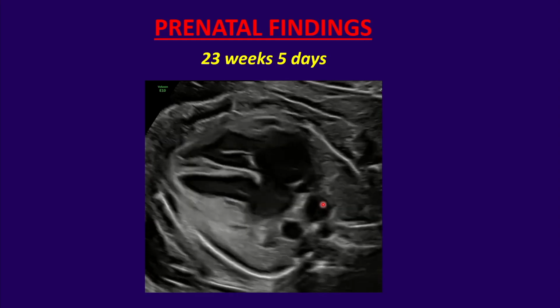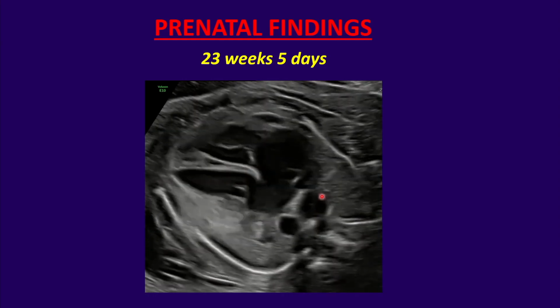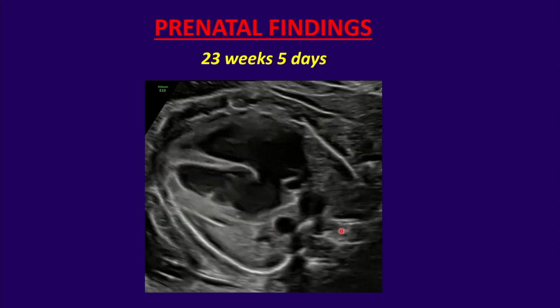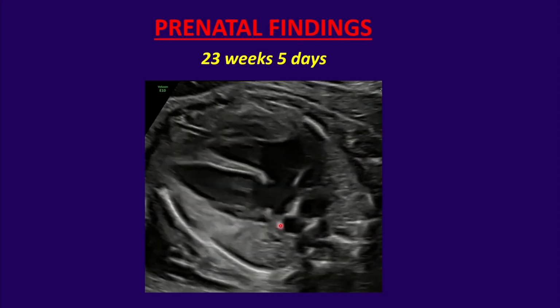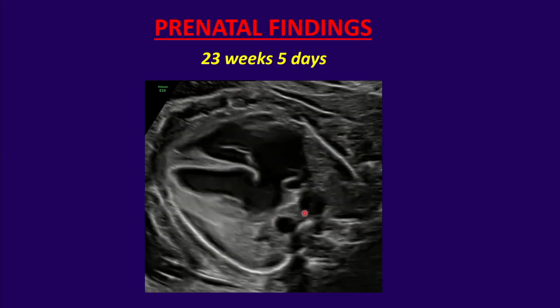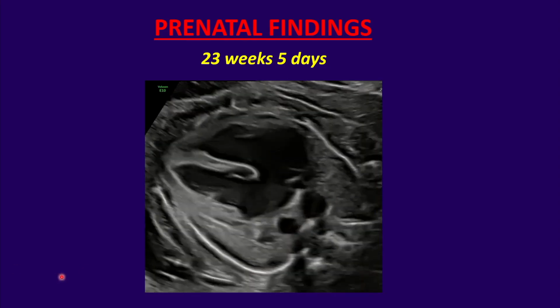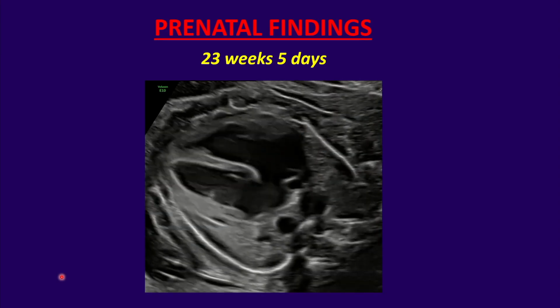And even though we don't know what specifically this vessel is, this is a really big azygos vein, if this is an azygos vein. Right, so it's even bigger than the aorta. Remember, it needs to be 3 times smaller. This is huge, okay? So maybe this is the source of the volume overload for that 4-chamber view.